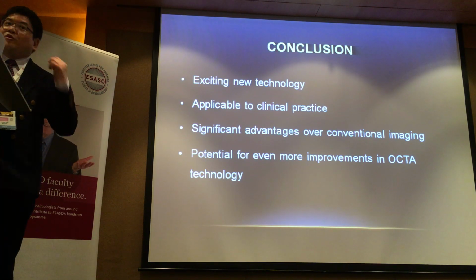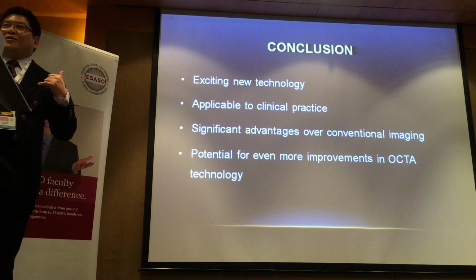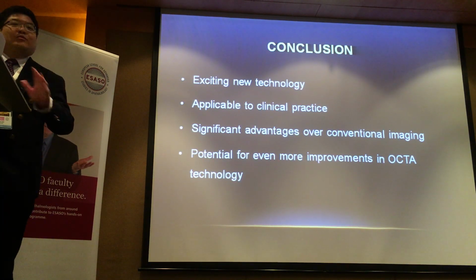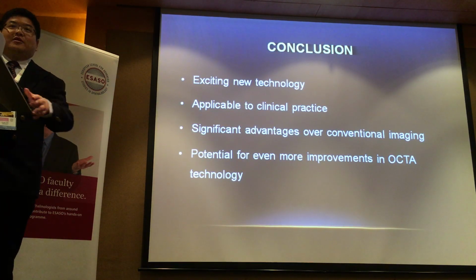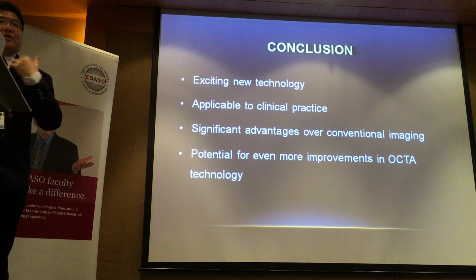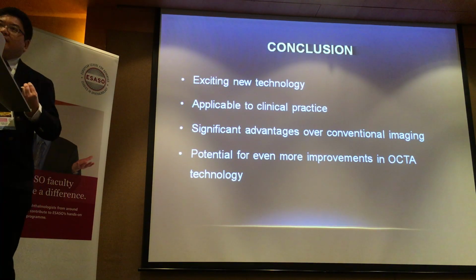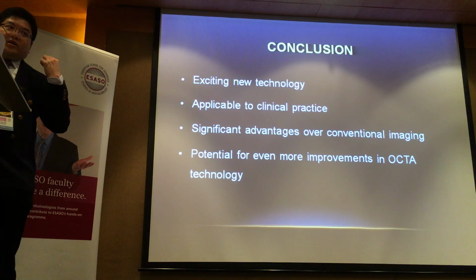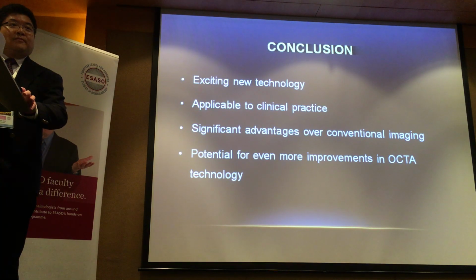That's the key point. And I had to call my colleague who was in the laser room and say, wait, I'm coming over, let's talk. In the end, they didn't. But of course, it's up to them, right? Ultimately, it's a clinical decision. But in the end, yes, it was not laser. But realize the difference. I could be wrong, but as far as I know, the patient didn't develop NV. So I could be wrong, but the fact is, this is how you can have two very different interpretations of OCTA, all right? And how it could totally change your management, all right?